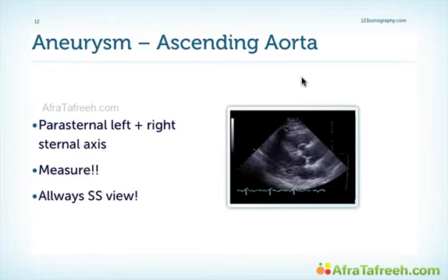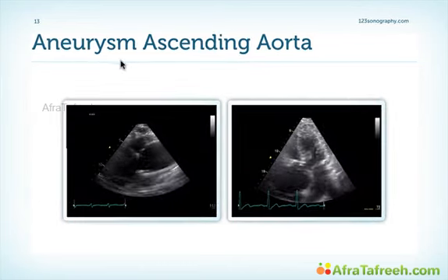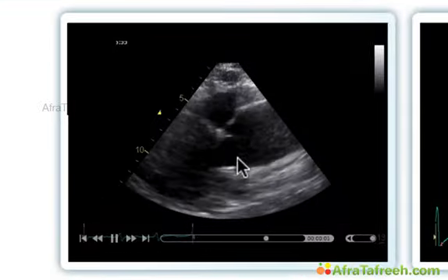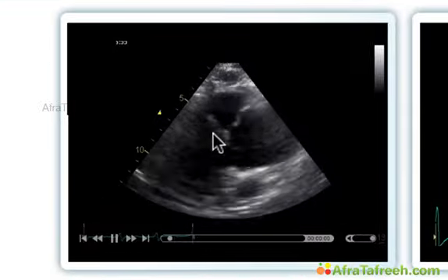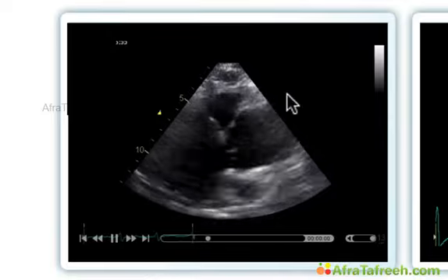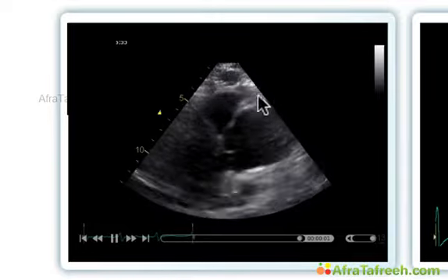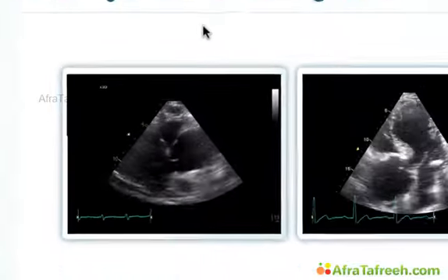Here is a special form of aneurysm which only involves the right coronary sinus. This you can also see with the help of transthoracic echocardiography. The patient on the left has an ascending aortic aneurysm which involves the ascending aorta and to a certain degree also the aortic root. Remember, however, that we do not see how the aorta continues here, so we cannot say if what we measure here is really the maximal width.